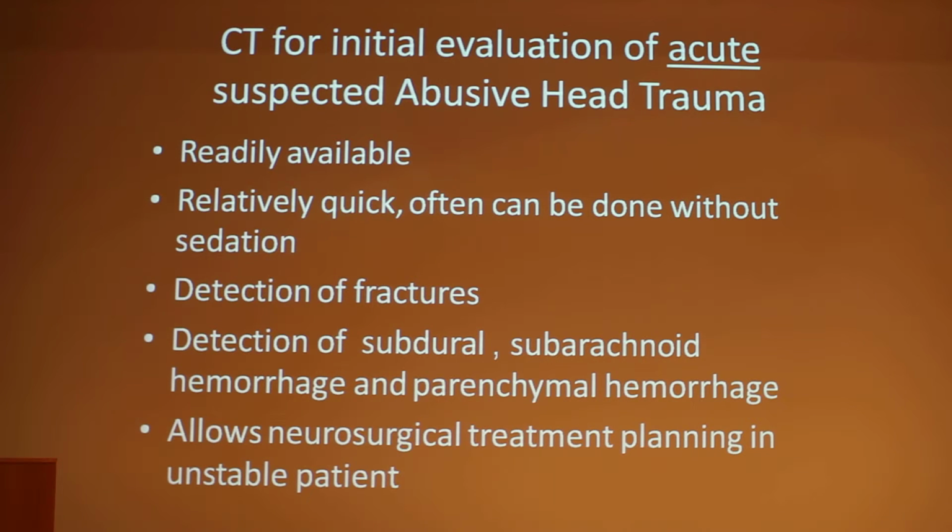And we use the CT because, you know, it's still the first line in urgent cases. When we have to perform the examination now, it's available, it's quick. If there is need to treat, we can do it immediately. It's a very good modality to diagnose fracture and to diagnose all kinds of hemorrhages.